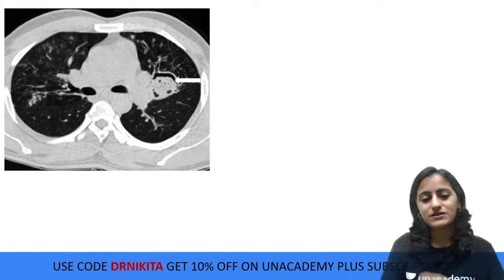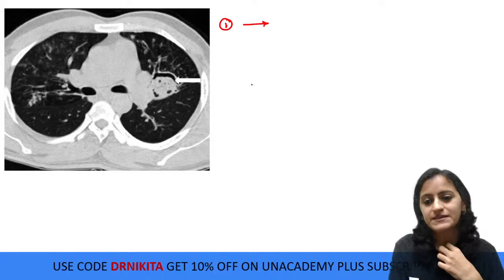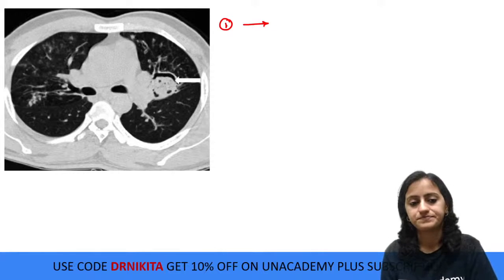Now let us start with the signs in respiratory radiology. This is the first sign here. Tell me, what do you see here? What is the sign that we are seeing here?